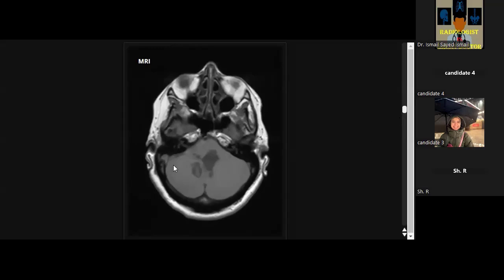I would like to review the T2 weighted and diffusion images of this patient. On diffusion weighted images, the lesion shows diffusion restriction, which in my routine practice I would like to correlate with the ADC maps as well. So, based on these imaging findings, my most likely diagnosis is intraventricular epidermoid cyst. However, I would like to correlate with the ADC maps as well.